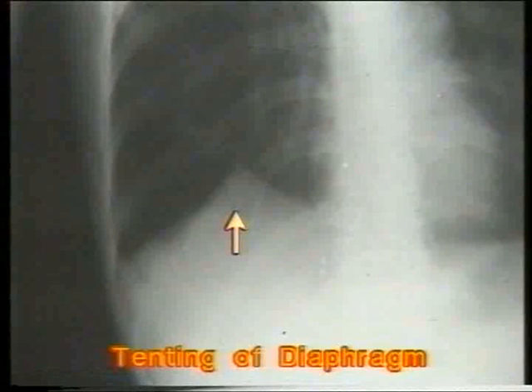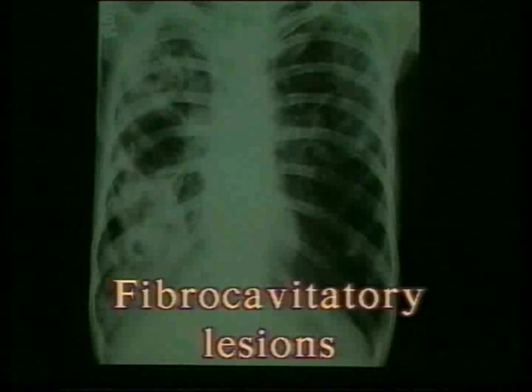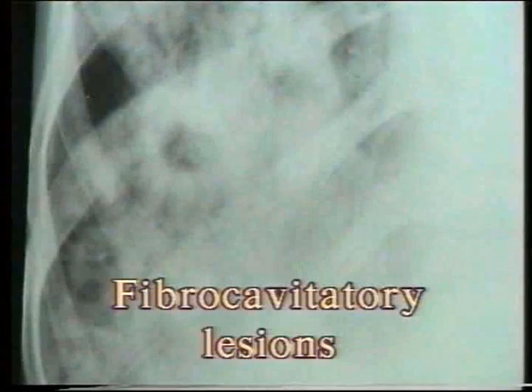In our country, very often, the tuberculous lesion is more advanced, more extensive, and is seen as a combination of fibrosis, infiltration and cavitation, termed as fibrocavitatory lesion.